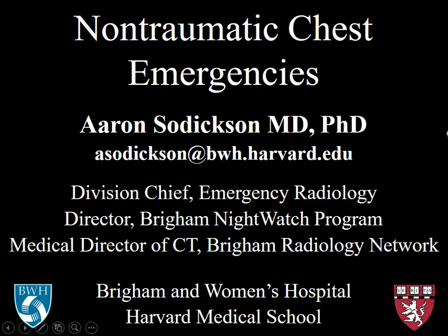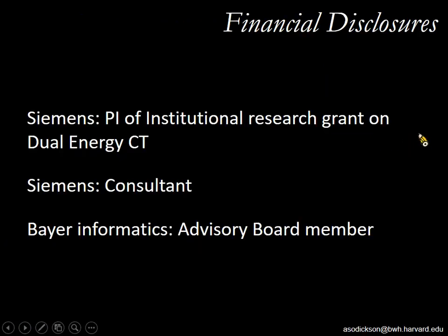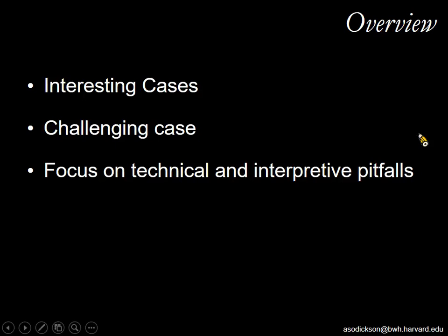Okay, so everyone's had some coffee and we're all wide awake, and we'll do another session. This one is also very similar, mostly case-based like the last session, but I have some questions for some of these cases for you to answer. I'll be focusing on some interesting, challenging cases. I tried to select cases that emphasize some either technical or interpretive pitfalls in chest imaging in the emergency department.